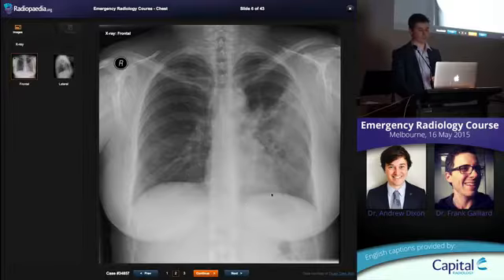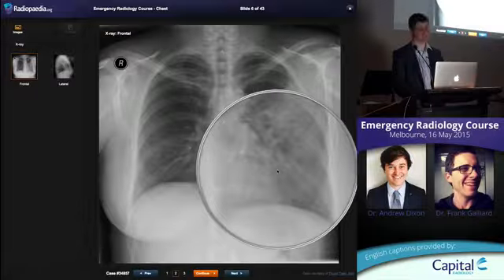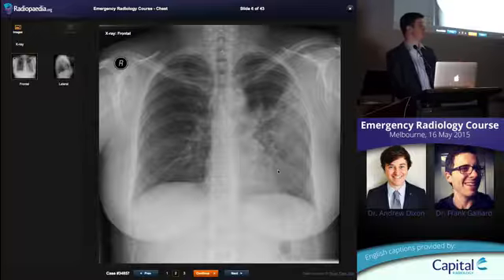And then we look at the interface with the mediastinum. You can see a beautiful hemidiaphragm here. The left heart border, however, is very hard to find. You can see the right heart border. Left heart border, barely can tell where it is. That helps us localise whether this is anterior or posterior within the chest.